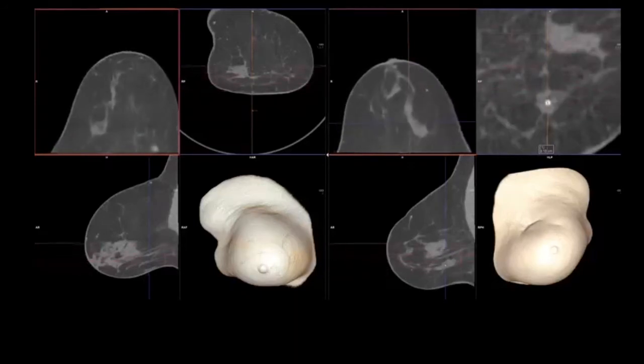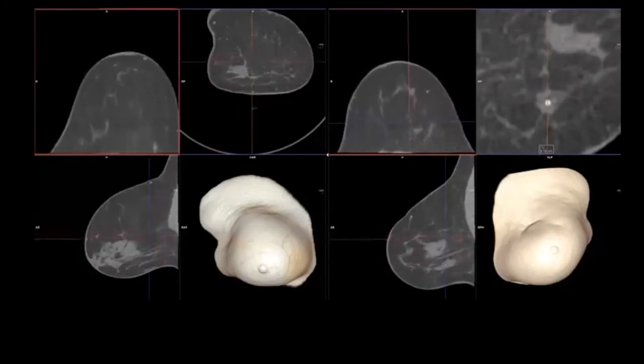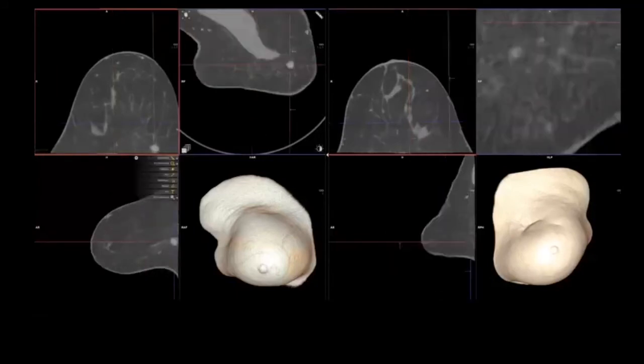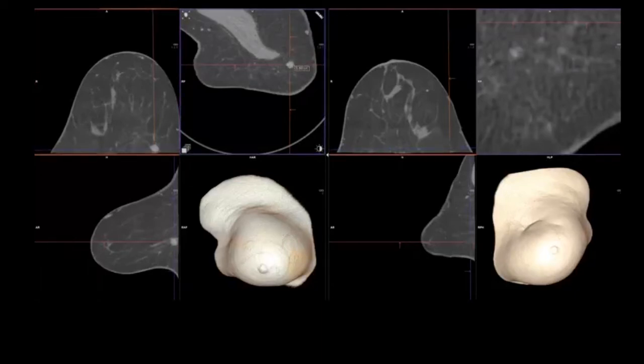And then you will notice that there's something going on in the right breast at 3 o'clock, prepectoral. This small, ugly lesion, it's unsharp. It takes contrast. It has some small feet. And this really looks suspicious for malignancy. So further evaluation is done.